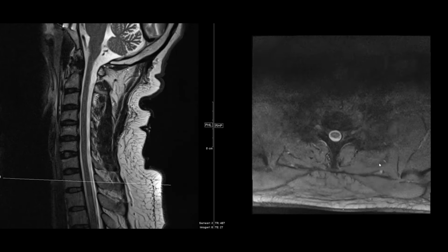Before you spend too much time focusing on the individual levels, you want to take a look at the soft tissues that are around the spinal cord and spinal canal. I think the sagittal T2 and axial T2 are really the best way to look at those. You want to focus on looking at the airway, the thyroid, and vessels. Definitely also take a look for any adjacent lymph nodes. Now this is going to be your chance to look at anything that's outside of the vertebral bodies and spinal canal itself. Now I'll draw your attention to a few things on this study because they are not normal.